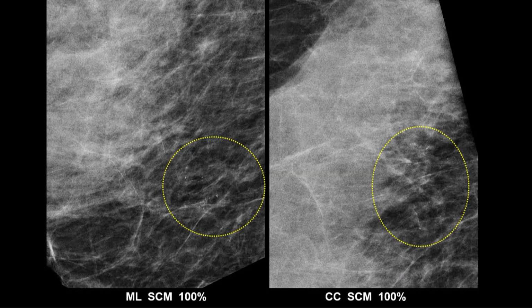In this case, when you look at the calcifications, most of them are round in shape, which might be consistent with a probably benign finding. Some of them are amorphous, which isn't so consistent with a probably benign finding. But it's not going to be a probably benign case if the calcifications are increasing in number, because then you already have a demonstration of growth.